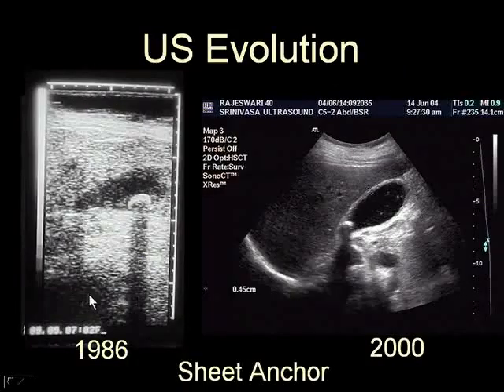The evolution of ultrasound: this was a picture taken in my practice in 1986. This is a picture taken in 2000, and you see the ocean of difference, and that is what ultrasound has been all about over the years.